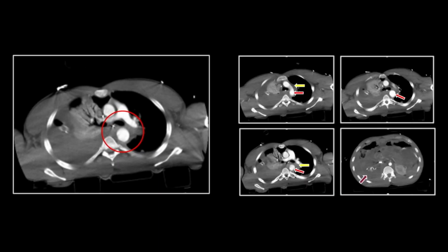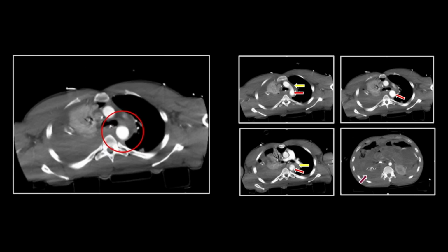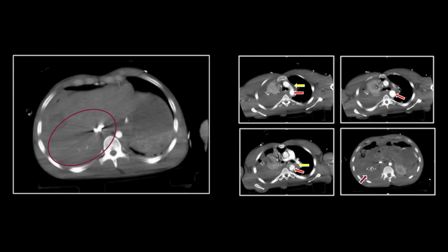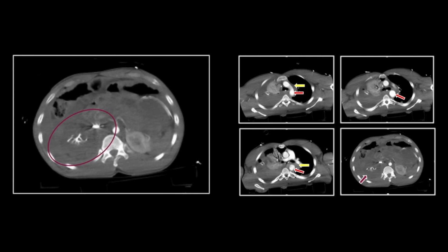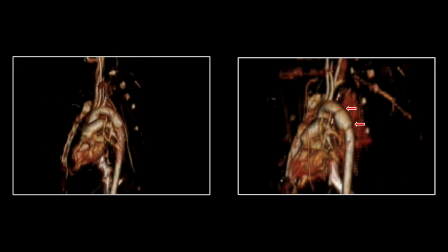There is the intervening segment of dilation, and you see the two torn ends of the aorta, proximally and distally. In the abdomen, there is right suprarenal, IVC, and right renal contrast backflow, and again note the asymmetry of the nephrograms. On the 3D, it becomes quite clear the nature of this injury, a complete tear through the aorta with retraction of the torn ends. You see it nicely there on the 3D.